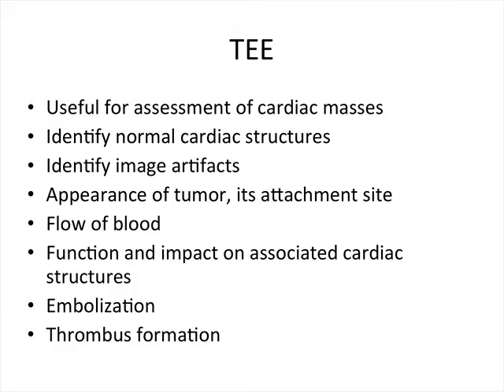TEE helps to identify normal cardiac structures as well as image artifacts that might be interpreted as tumors or masses. As TEE is able to image cardiac structures in multiple planes and angles, it is excellent in delineating the appearance of the cardiac tumor, its vascularity, and its attachment site to normal structures.